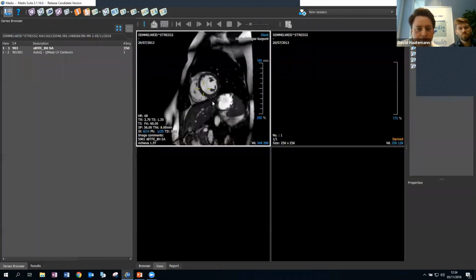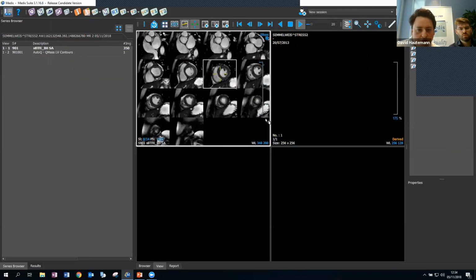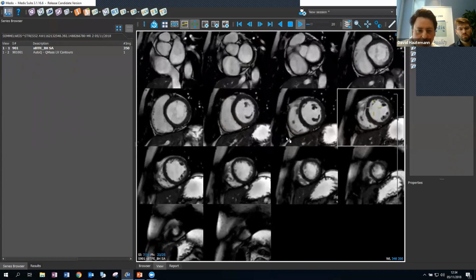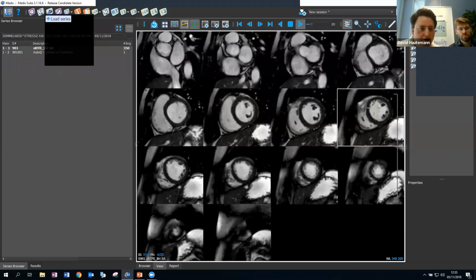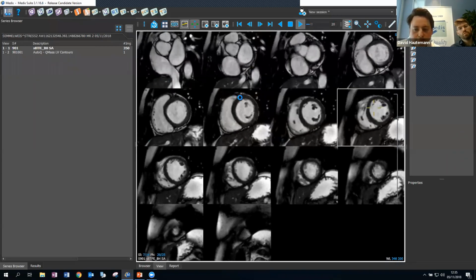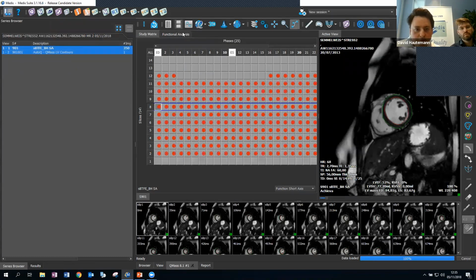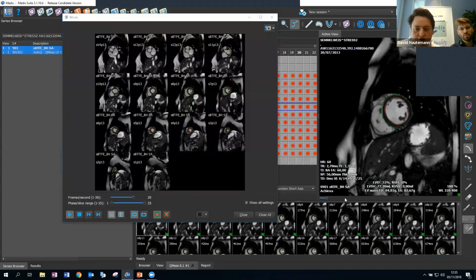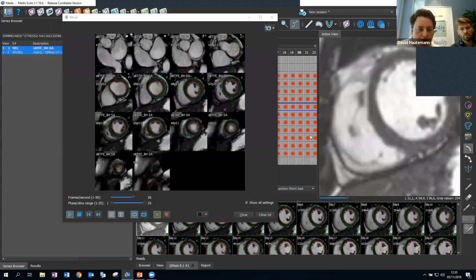It was also from Hungary. There were some wall motion abnormalities here, I think. Well, let me just show you the result here. So all the cases that we just showed you, the algorithm was not trained on any of these data sets.